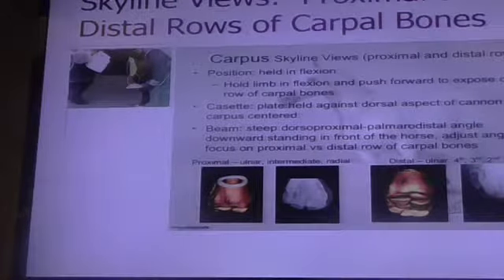almost like your fist. So you're seeing the articulation between intermediate and radial carpal. Radial carpal, intermediate, and then ulnar carpal is the smaller one. Okay, so that's the proximal row.